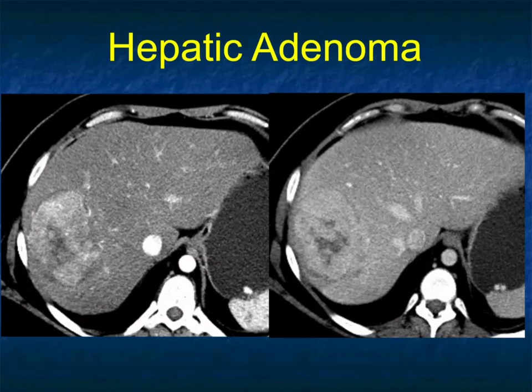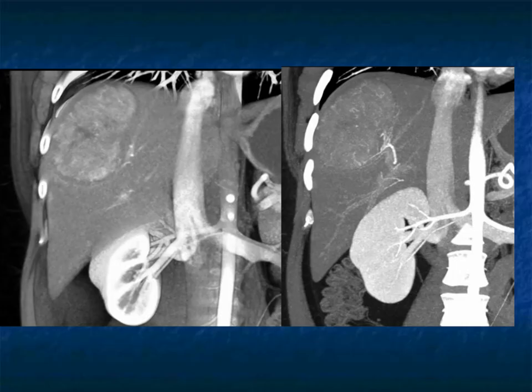Another example, vascular lesion, arterial and venous phase imaging. This lesion, the liver texture is a bit irregular. I would worry about a vascular hepatoma here. Could also consider cholangiocarcinoma, though the vascularity pushes me more to hepatoma. This was hepatic adenoma. You see the feeding vessels.